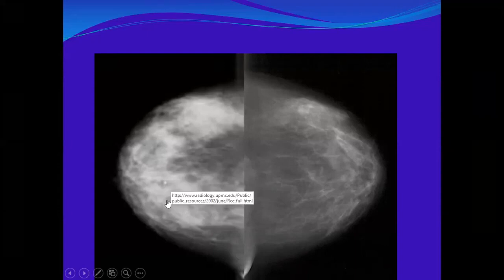I can see some densities here, but I'm not sure about these densities. True calcification or no? I am expecting these might be extensive calcifications, but I am not going to exclude it, and I'm not going to mention it. I will say the study is suboptimal. The only abnormality I could appreciate is extensive global asymmetry. I need to proceed.